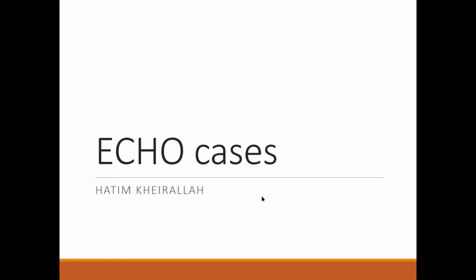Okay, this session is going to be about echo cases, cases for the exam. Usually these are the sort of cases you are going to encounter in the exam. Although I'm not going to cover them all, we are going to give you hints and glimpses about how you describe the echo case. I know that in your exam you are going to describe cardiac data in writing, so that probably needs a little bit of technique.